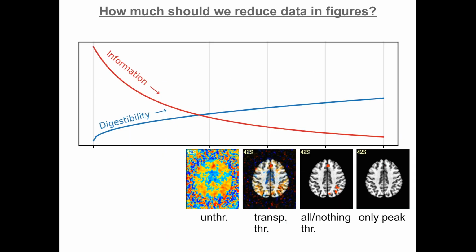And so if we think about how these things are lined up, I would probably make the case that as we think about which of these we might want to choose, having unthresholded data, in reality, is more informative, but it just seems a little bit too much. It's hard to interpret, with visualization problems, to see the underlay and things like that as well. So I would make the case that this is probably a little bit much for an individual paper to report, although again nowadays there are repositories for uploading unthresholded statistic results and hopefully effect estimates along with them.